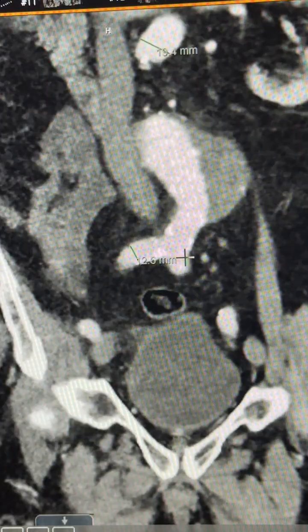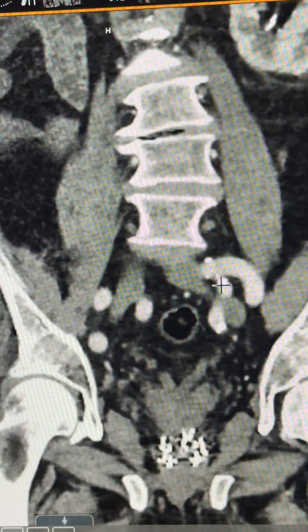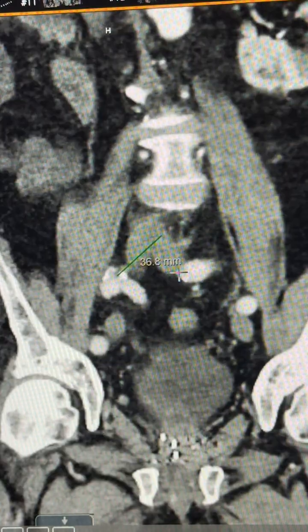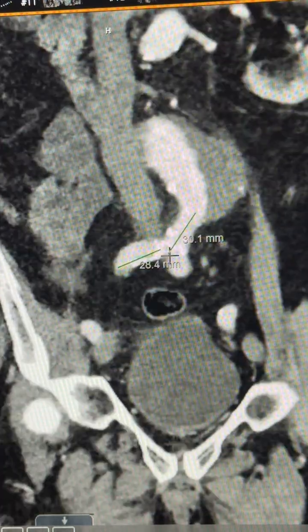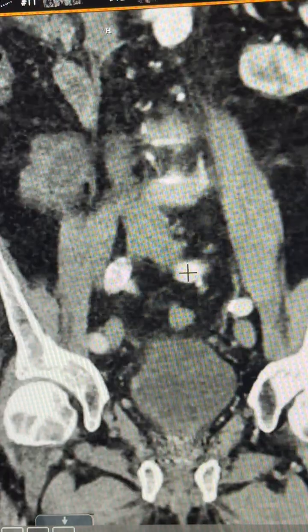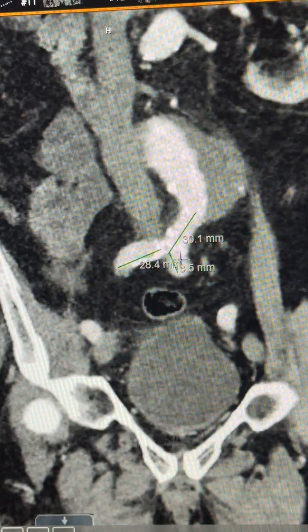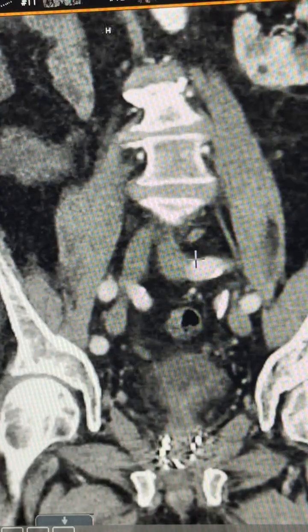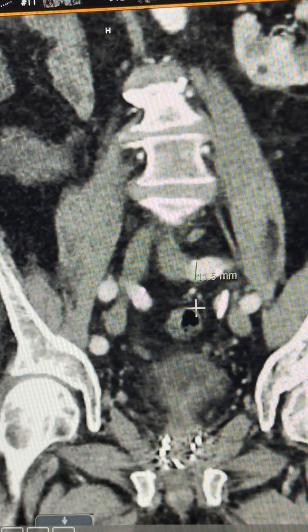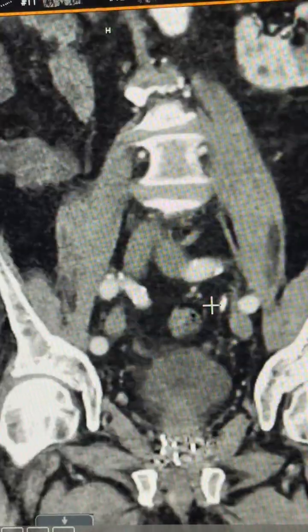And then over here on this side, again very short common iliac, the hypogastric comes off right there, so that's just 22 plus, and there's the bifurcation right here. Yeah, 22 plus 13, about 30 on the common iliacs. They're very short common iliacs. And then 11 to 12.